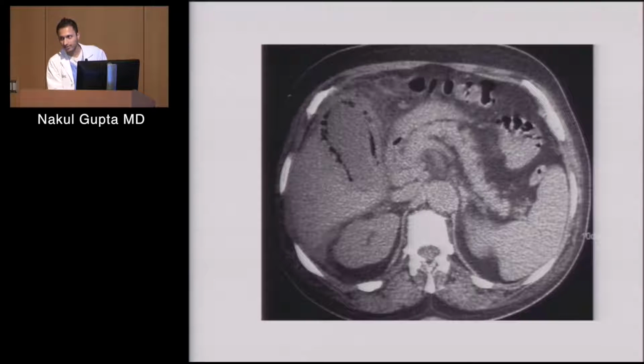That's one of our signs that something's happening there. Something is causing this fat to be inflamed. And in this case, it's the gallbladder. It's distended. There are pericholecystic inflammatory changes and air in the gallbladder wall. This is emphysematous cholecystitis, a sign of a very severe cholecystitis. The gallbladder is so infected that the gallbladder wall is already dying and necrosing.